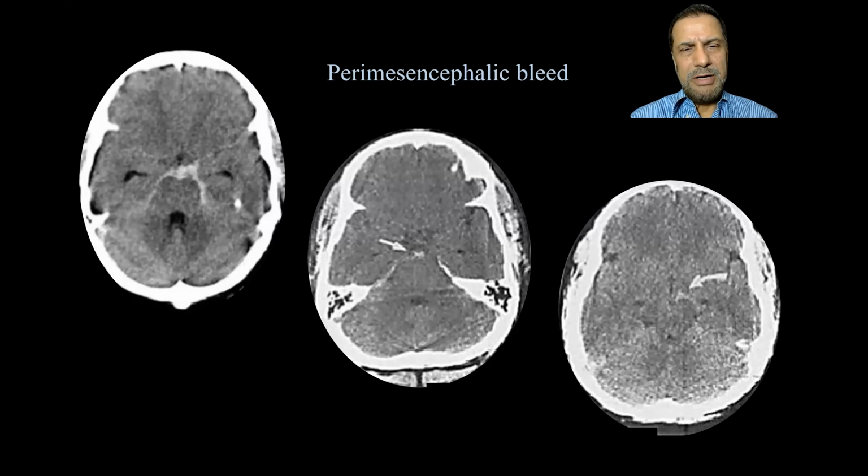And the bleeding can happen inside the brain, but not actually in the parenchyma, but on the surface of the brain, just like in this perimesencephalic bleed with a little bit of hydrocephalus, pretty tight brain, and anterior to the pons, and in the cerebral peduncle there is some blood seen. But in these cases, this is a subarachnoid hemorrhage.